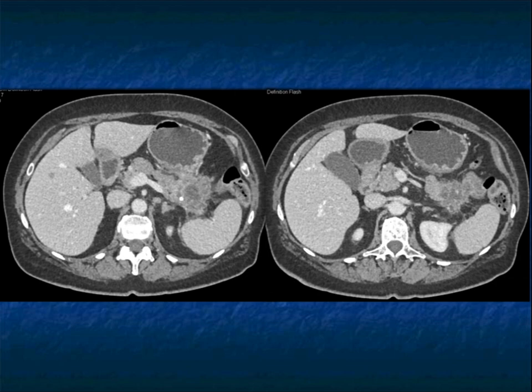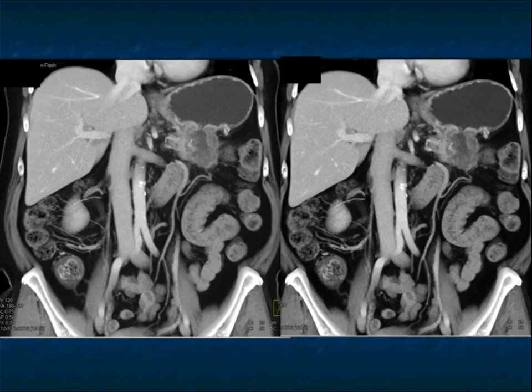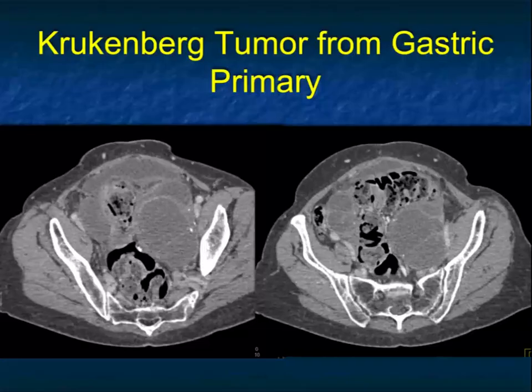So with gastric adenocarcinomas, when you have ulcerations, when the tumors grow large, local invasion of stomach, perhaps colon, and even spleen can occur. And you can see just some examples of why the coronal view is particularly helpful in showing the extent of disease. And here's some 3D imaging which shows it very nicely as well.